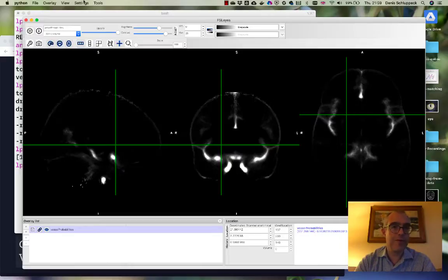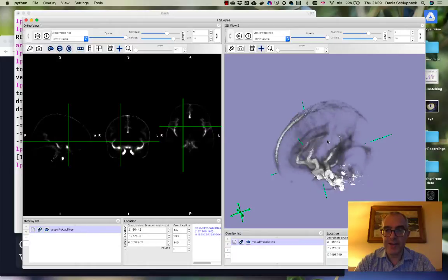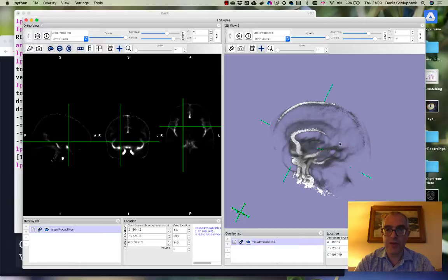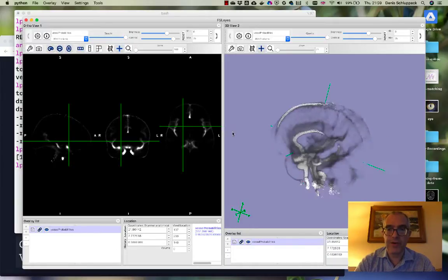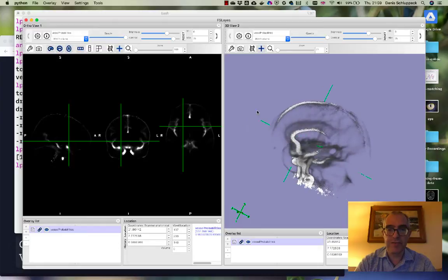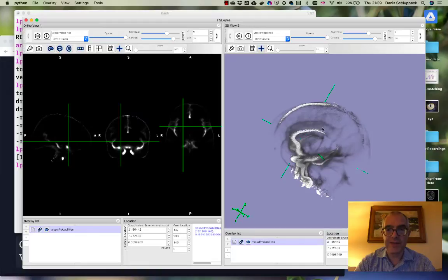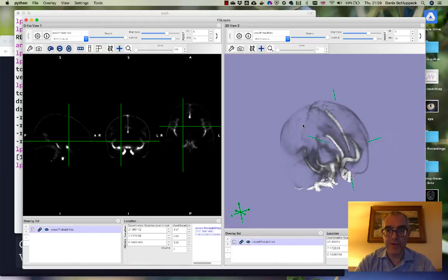So there's one very cool thing you can do, even in fsleyes here: change to the 3D view. You may have done that in the lab class before as well. And what we get is one of those surface representations. So the one that I created using an extra command line call, you can actually do it for lots of images. You can do it straight in the viewer. Now, the issue here is that the algorithm that gets used is a little bit hidden away from us.